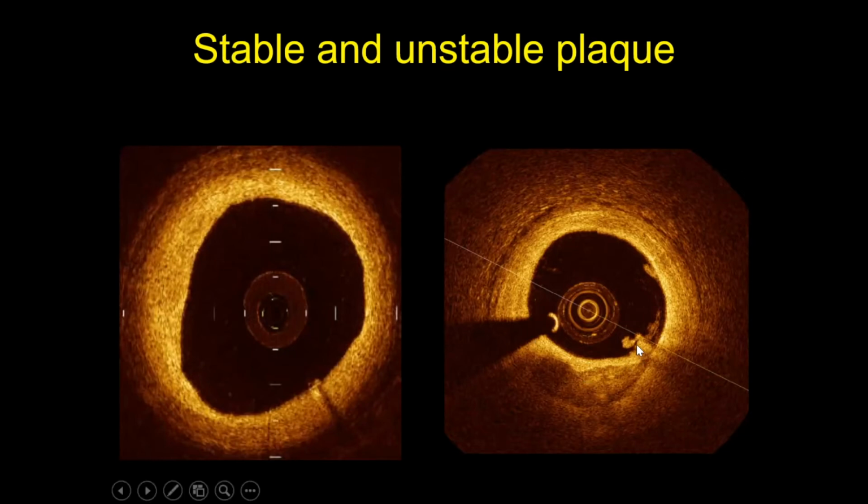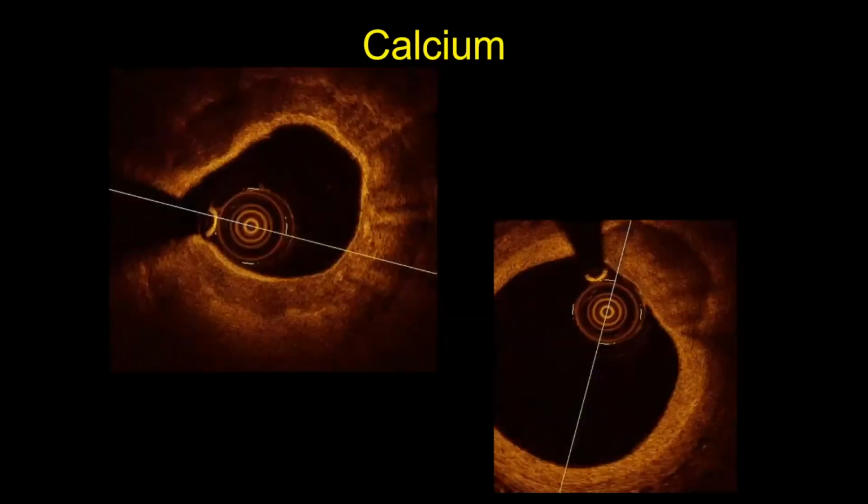And as we said, there is a protruding irregular kind of mass. That's a small thrombus there, but you can see the vessel beyond it. It is not causing so much light attenuation. So it's probably freshly formed platelet-rich thrombus, with a ruptured plaque or eroded plaque. Okay, we have talked about calcium.